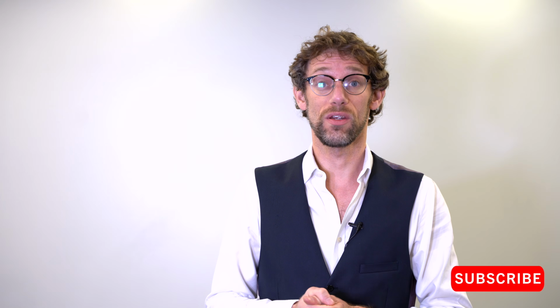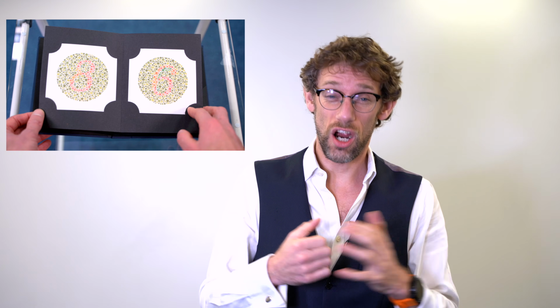My name is Dr. James Gill, and you've joined me here today to look at the Ishihara charts and a little bit of colour vision. The Ishihara chart is used to determine if someone has a problem with their colour vision, or is colour blind, as this is often termed.